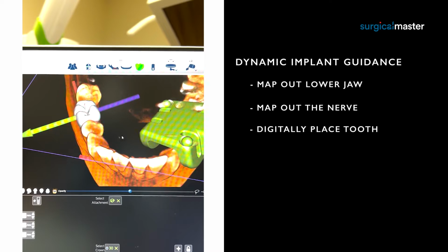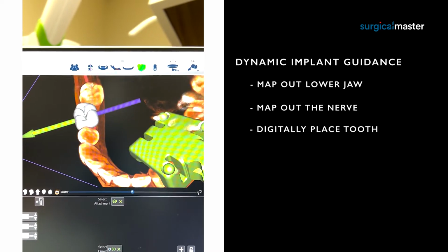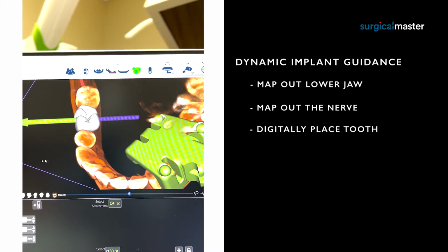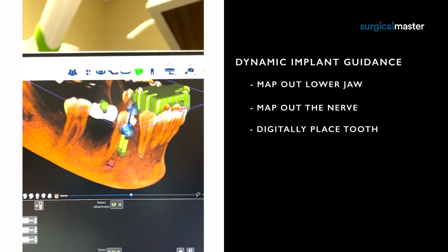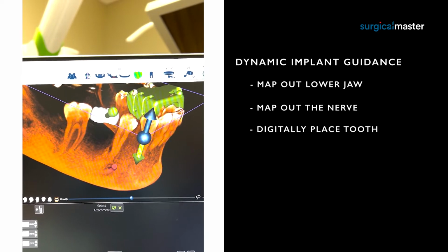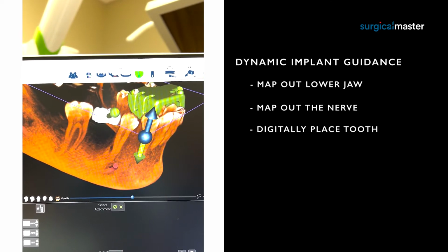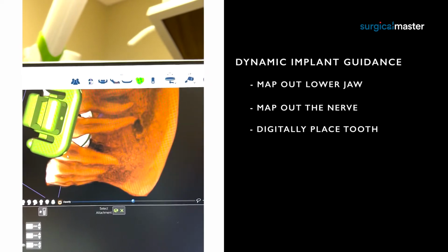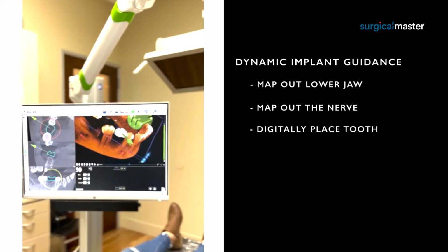Yeah. So then I'm gonna move it a little more in, twist it a little like that. Basically play with it till I get it where I want it. Okay, so that's called planning. We're basically starting with the end in mind.